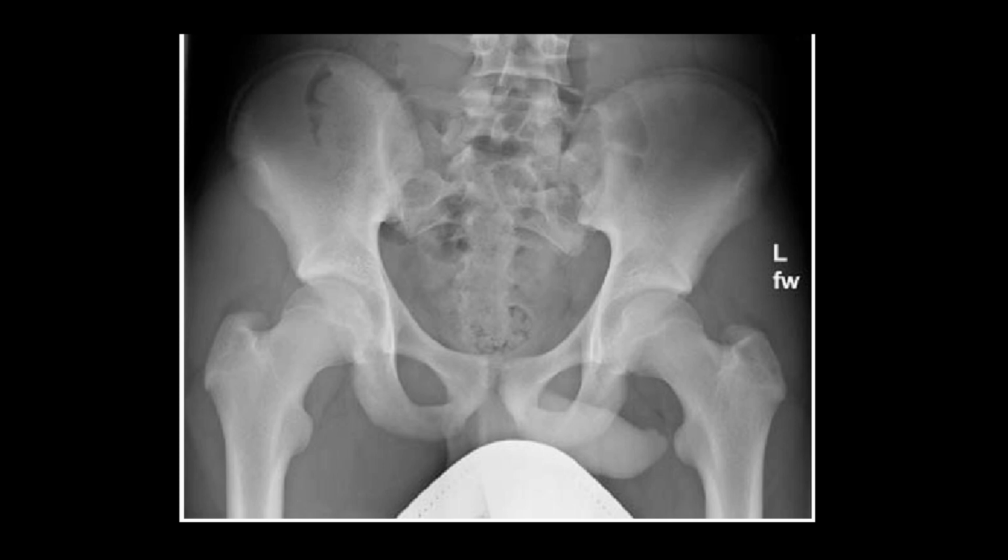So hopefully you've paused it and had a look at where you think you can find the abnormalities. Firstly, we're going to check the alignments with A, and again, if we've traced the spinous processes, it's roughly in line with the pubic symphysis that we can see over here. Now the next thing will be to trace the pelvic inlet, and if we start over here, we'll find that there's a step over here right where our sacrum meets our iliums. Now this over here suggests a dislocation of our sacroiliac joints bilaterally, and so that's our pathology.